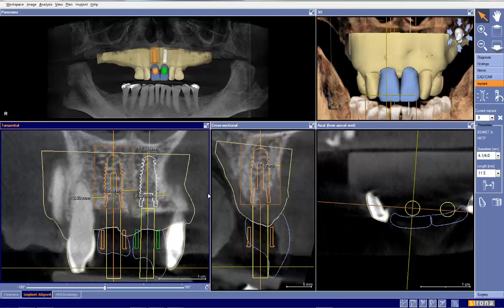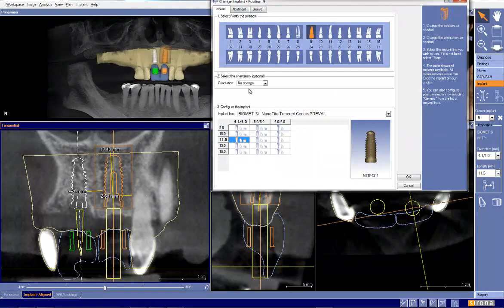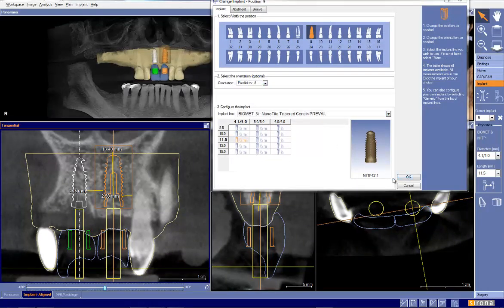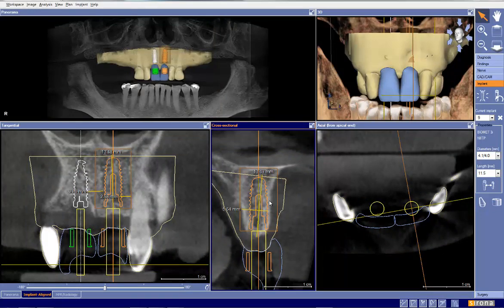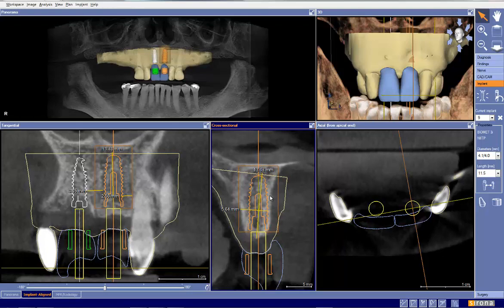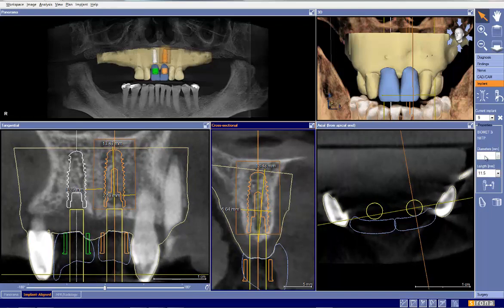So there we go. The next thing we'll do is look at tooth number 9, and my first assessment here will be to go ahead and parallel it to number 8, which we have done here. And I'm going to say that this implant is definitely way too close here. So either we're going to need to do some significant bone grafting, or we're going to need to move the implant here like so, and even then it's still too thick. So I would maybe consider going to a narrow implant, or I would consider doing some ridge splitting here, or using expanders when I do my osteotomy.